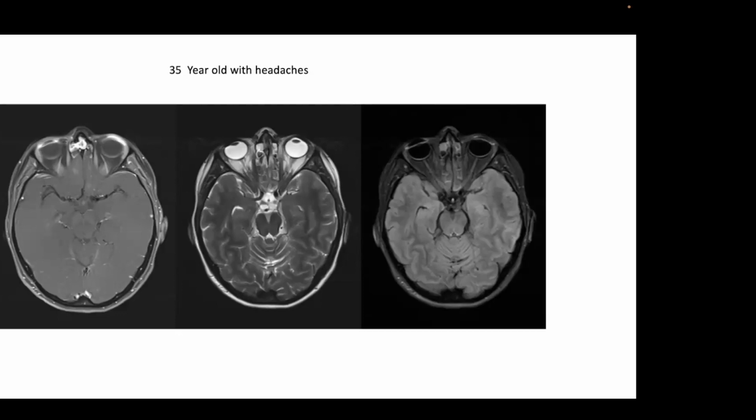Women who put on a lot of eye makeup may get this artifact over the globes from the pigment, I guess the eyeliners and so on. So this is not abnormal. Now, you can see it's problematic.